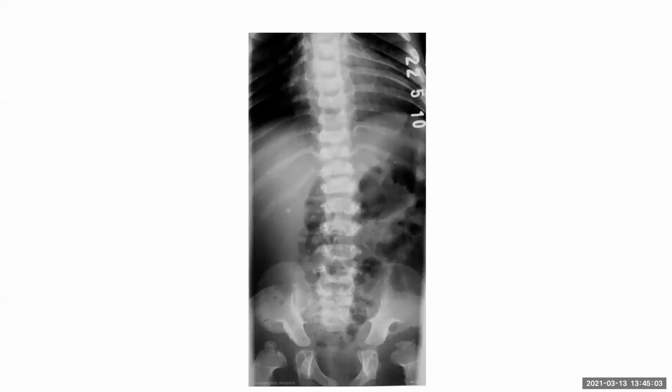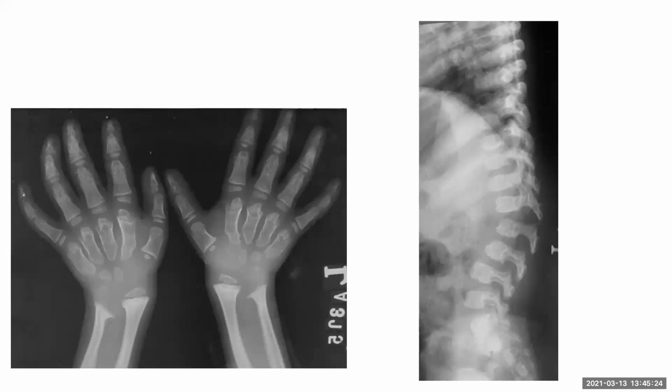If you see this radiograph, these ribs are oar-shaped ribs. Yes, and this acetabulum is slanting. This is typical of MPS. Both proximal femoral epiphyses are small and irregular, which mostly occurs in Morquio type. But in our case, there was inferior beaking. And there is proximal tapering of the metacarpals and Madelung-like deformity of the ulna and radius.